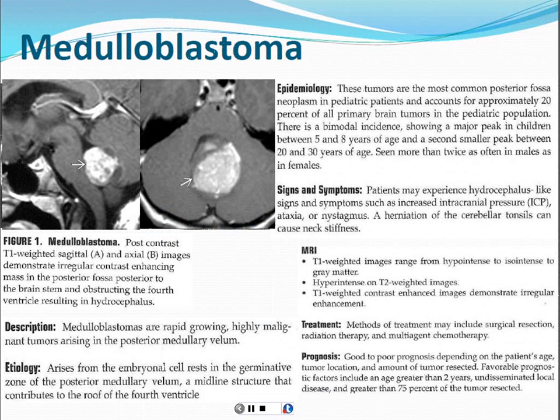This is a medulloblastoma. This is something that occurs in pediatric patients. You don't usually see this as frequently in adults, so they can come around in like their 20s, 30s with this, but you much more frequently see it in pediatric patients. And where it is here, in this case, it's obstructing the fourth ventricle. It's kind of taking up the whole space of the fourth ventricle. It'll obstruct the flow of CSF from the lateral ventricles here and the third ventricle, which is at the midline, from doing its normal pattern of flow down around the spinal cord and up around, outside of the brain.